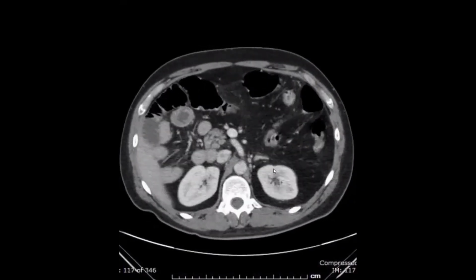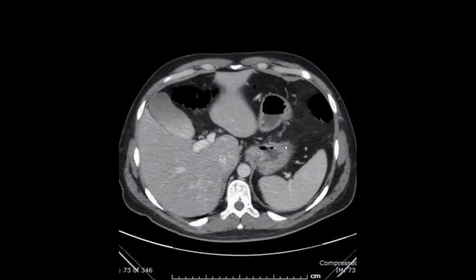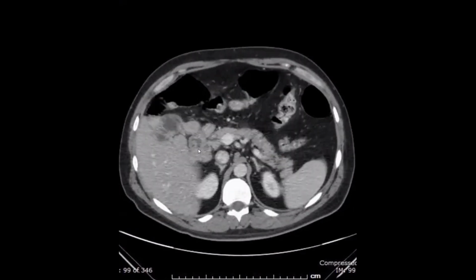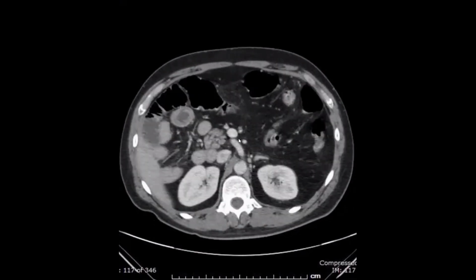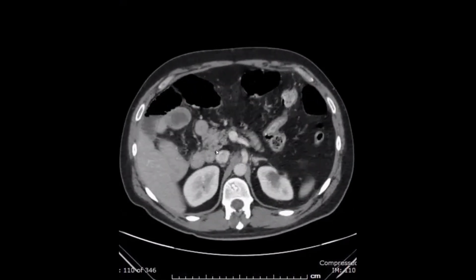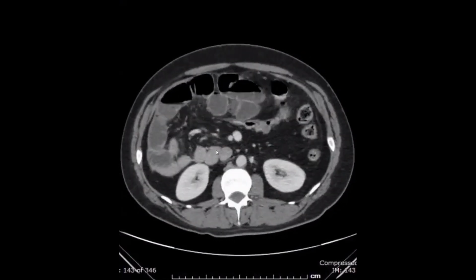Okay. So we start from the stomach upside. This is the stomach, and this is the duodenum. The straight duodenum coming down. This is the third part of the duodenum. And exactly where is the duodenojejunal junction? It is on the right side. It doesn't cross the midline. Is that correct? Very nice, exactly.